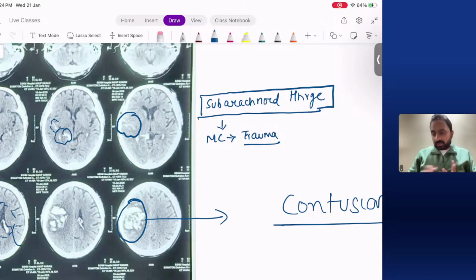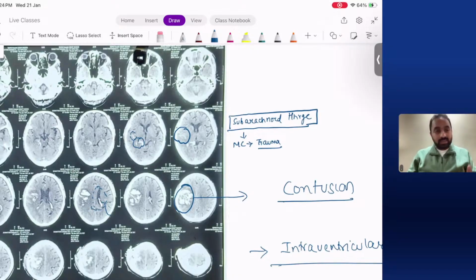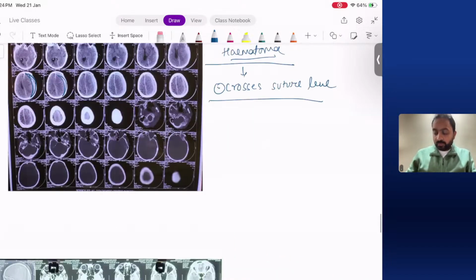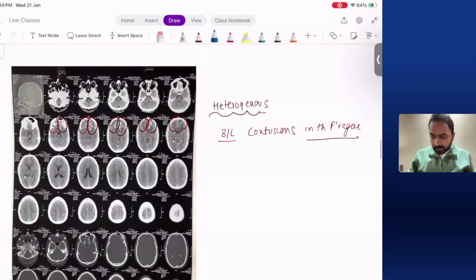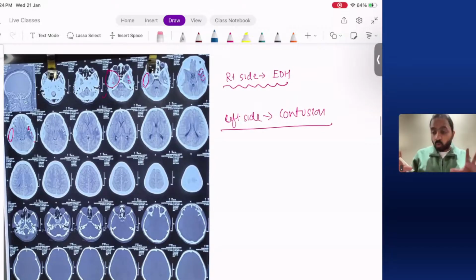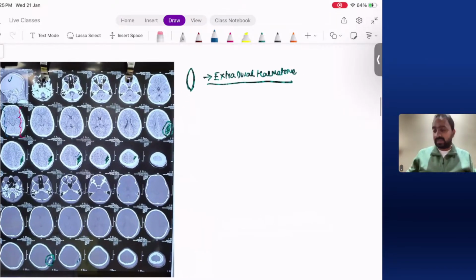Right. So these were a few CT scans which I had selected from my clinical collection. So I hope this helped. Before wrapping up, I shall make you go through them again. The basic purpose of this class is to orient you to the basic imaging and not to give you a lot of information, because we tend to make mistakes in the basic diagnosis.